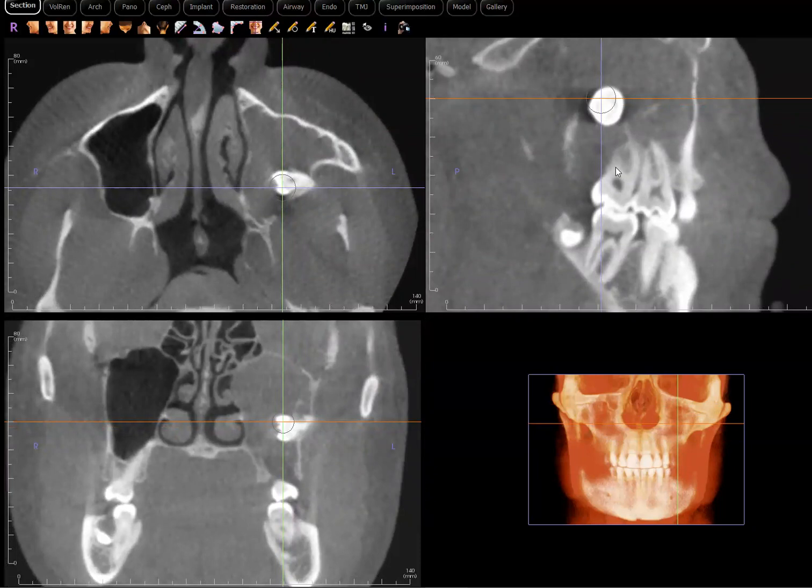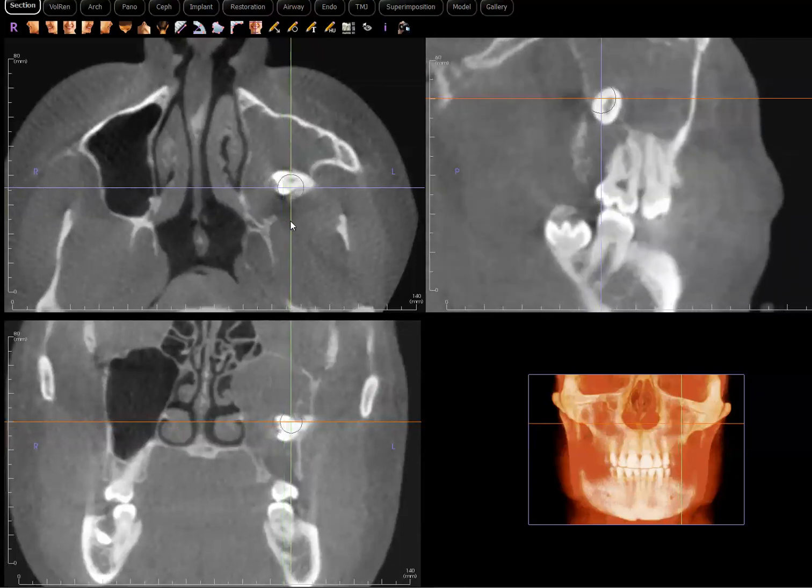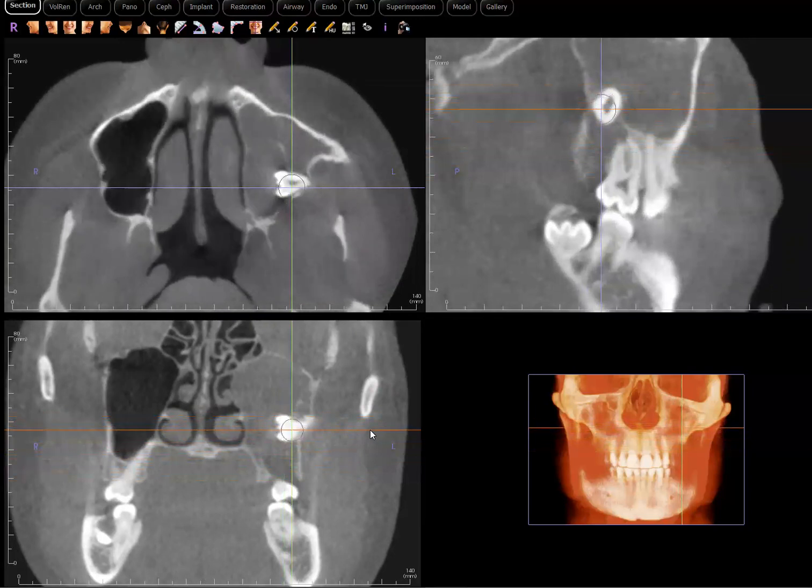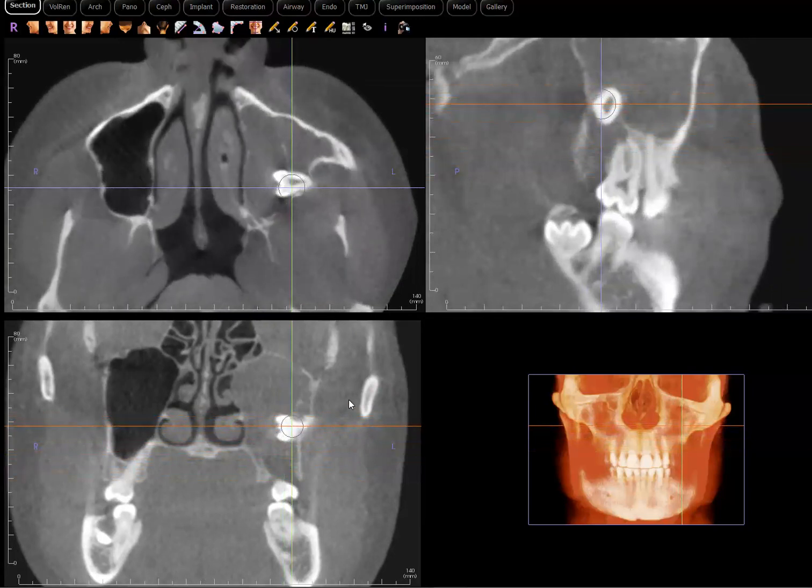That it can cause displacement of a tooth. In this case, it did cause mild displacement of the medial wall. However, it hasn't caused marked or severe expansion of the ridge. It did not cause any noticeable displacement of the adjacent teeth, number 14 and 15, nor do we see root resorption. So those are some features that I wanted to point out and hope you found this interesting.